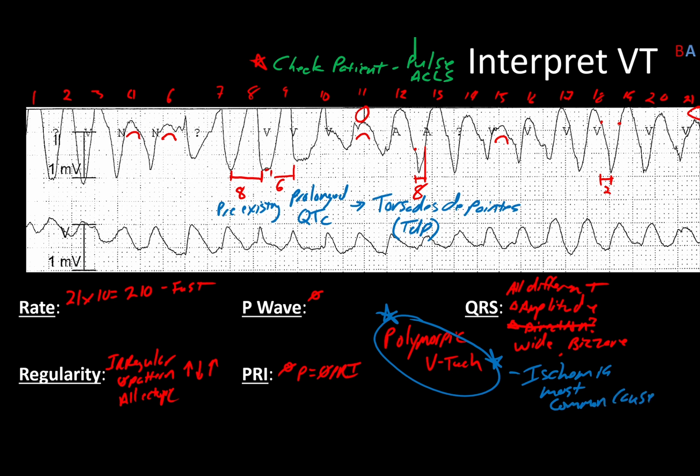So keep that in mind when you see it. If you see something that looks exactly like torsades, that's exactly the reason to treat the patient, assuming that there is potentially a prolonged QTc issue. So it's a good hint to have, something to be really aware of going forward. Ultimately, you probably need a 12-lead ECG or 12-lead EKG to really figure out exactly what the situation is.